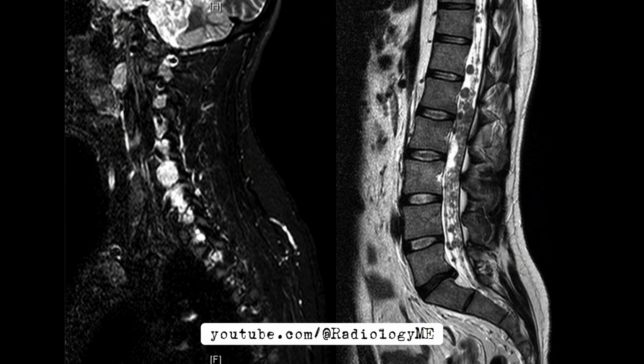Shifting focus to the MRI of the spine, multiple well-defined lesions are observed in the cervical and lumbar regions. These lesions are closely related to the nerve roots, appearing hyperintense on STIR and T2 weighted sequences. Enlargement of the neural foramina is another key finding, explaining the patient's sensory symptoms in the limbs.